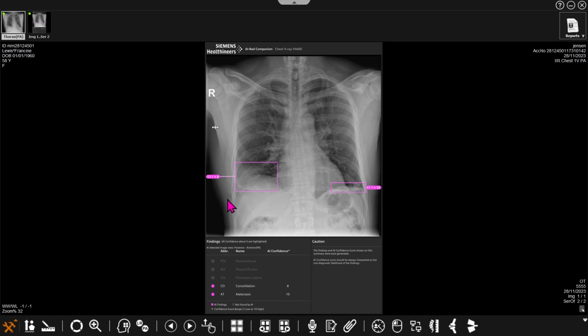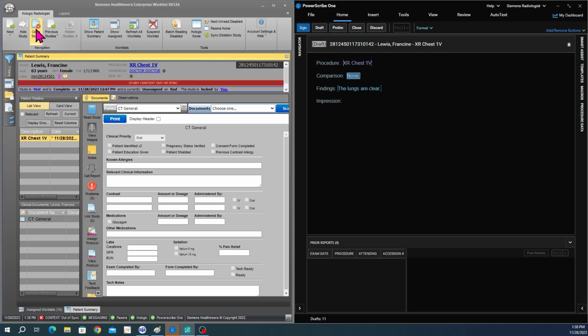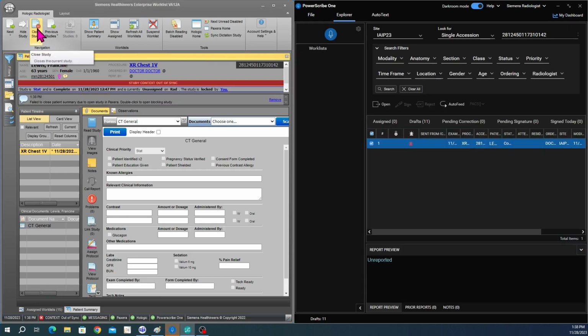The radiologist thinks this opacity may represent pneumonia, but remember that the patient had an increased D-dimer? Then this wedge-shaped opacity, well, it could actually be a pulmonary embolus. The radiologist can proceed to dictating the study and recommends a CT-PE, or pulmonary embolism, to evaluate for it.